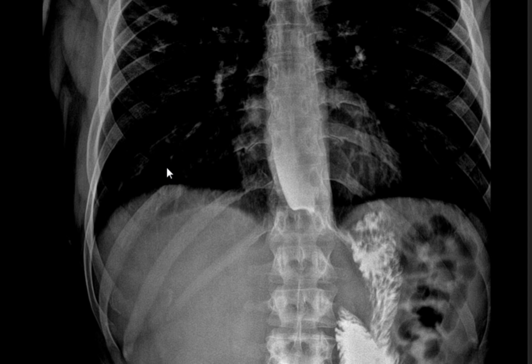It's some sort of parasite. We have no secondary achalasia. We have mostly primary achalasia. And in fact, this case has been suffering from achalasia for maybe 6 or 7 years with recurrence. They do dilatation and re-achalasia, and dilatation and re-achalasia. So it's just a basic, simple primary achalasia showing the rat tail appearance with a dilated esophagus.